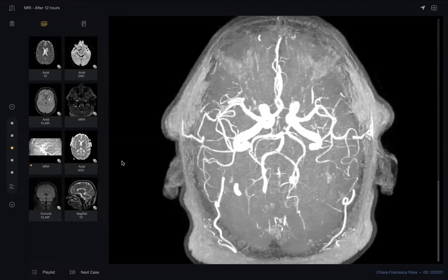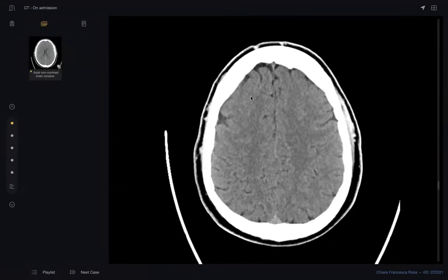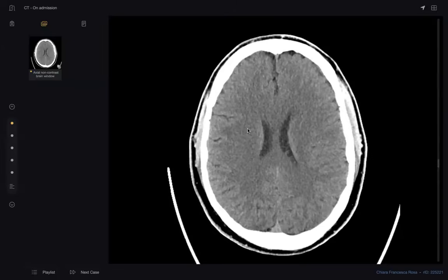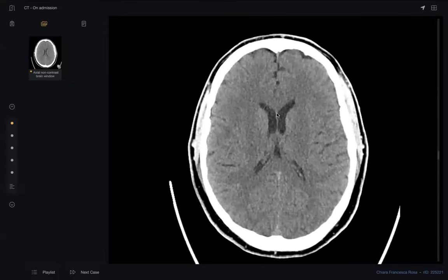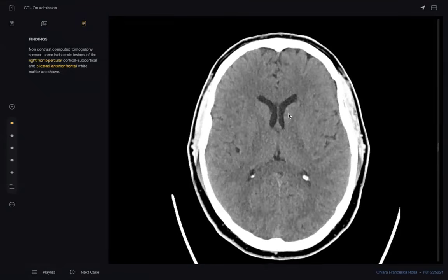You did very well. Your 5 minutes are completely finished now. This is acute infarction. You did very well when you picked up this subtle finding. See, my colleagues, this is the most difficult point here. The subtle finding is the main thing here. This one, right frontal, okay? And a little bit here, there is some little hypodensity. Look, this is one, and this one, very subtle.